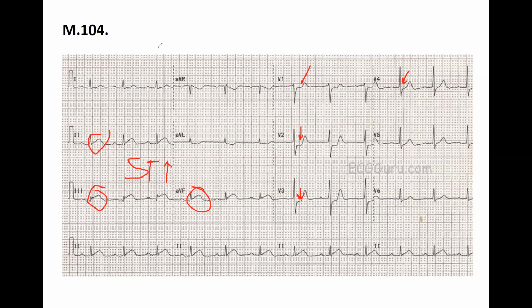So if this is the typical sign for having a STEMI, the mirror of it should be, if I can draw it, something like this. So that's a mirror image. So if you do see ST depression in V1, V2, V3, or at least 2 consecutive leads, you can see that this is an infero-posterior STEMI. All right.